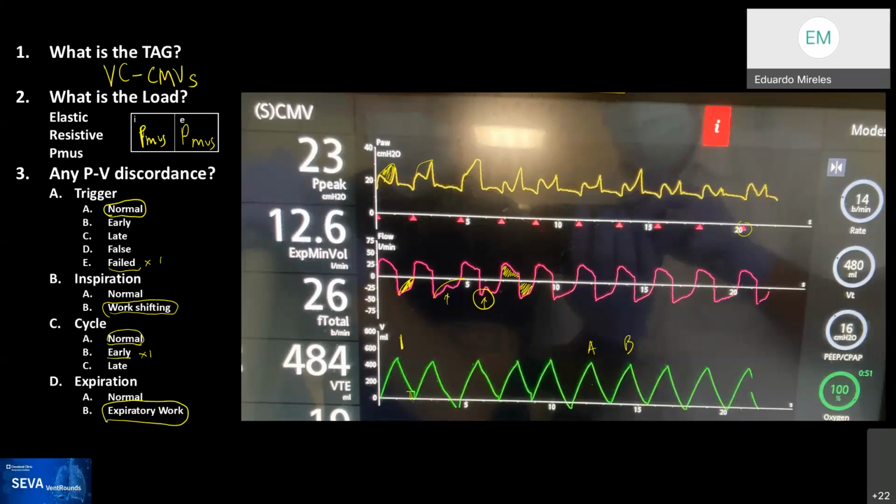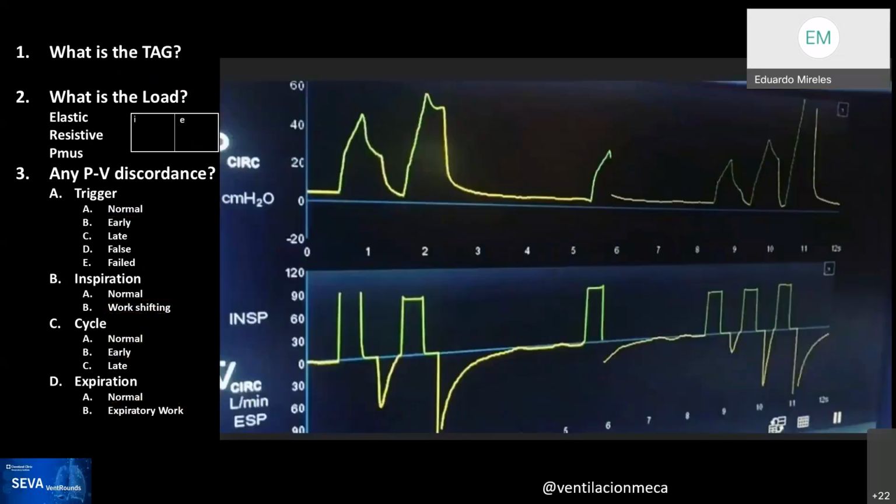So let's do one more. This one, I really love this one. This has generated a lot, and this comes from Federico Gordo Vidal in Spain. He tweeted this image, and then Ariel Garnero put it up, and it made me wonder about life and the pursuit of happiness. So, does anybody want to read this one?